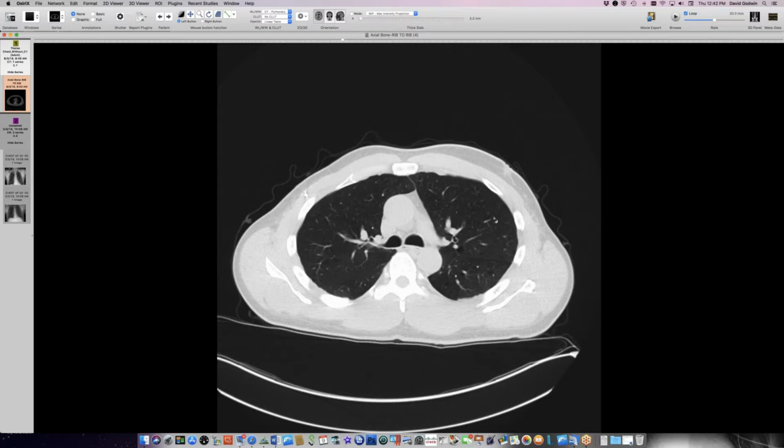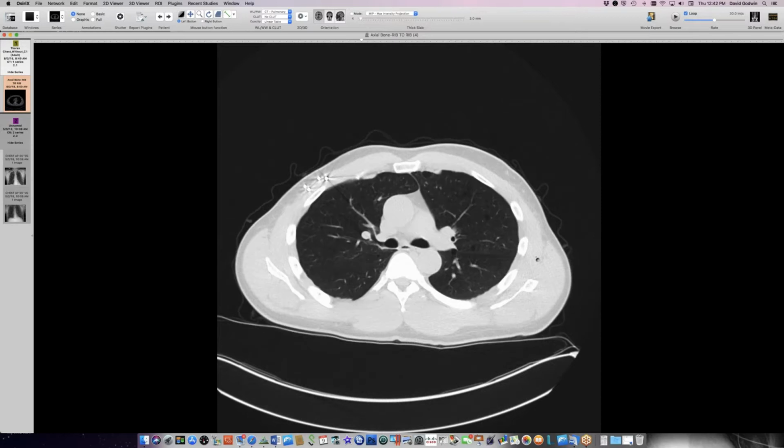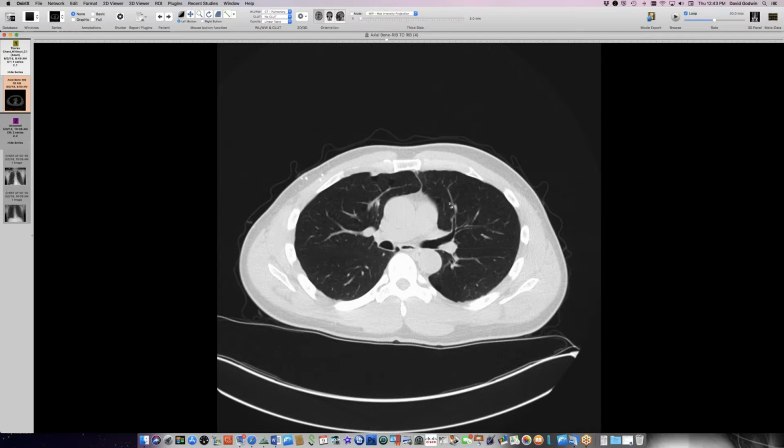The history we have says he's had multiple infections, but it didn't list what they were. So presumably people in other parts of the country knew more about him, had a better list of his infections. This one is on the edge here, so perhaps these cysts are left over from pneumocystis pneumonia.